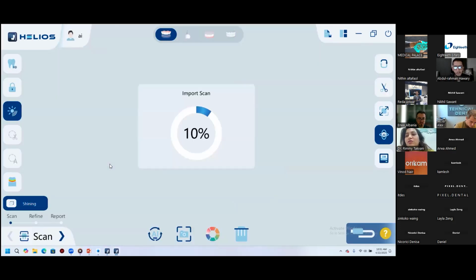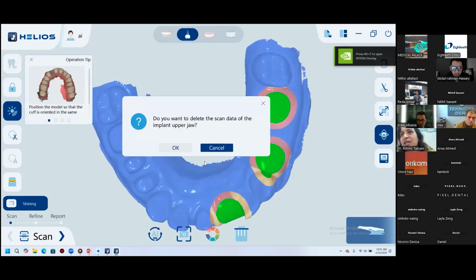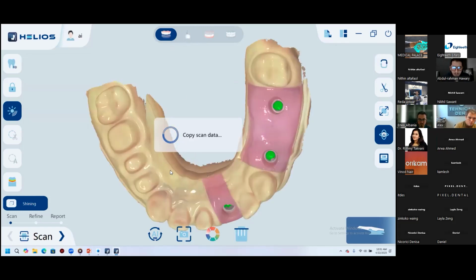Dr. Kamlesh, with the previous version also, we were able to reduce the size of the circle. The only glitch was that there is a point in the center. You have to take your pointer to that and then scroll your mouse. So in case you're working with your laptop, you may not be able to do it. It's always a wiser option to have a mouse with a left click, right click, and a scroll button. Yes, exactly. Thank you, Dr. Remy.